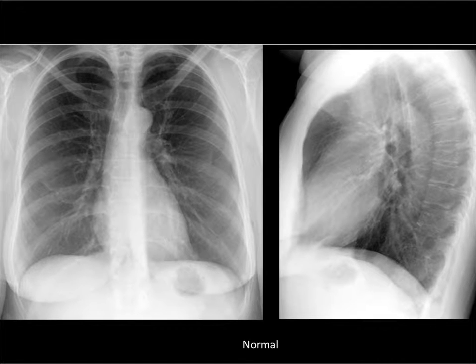Now let's look at the other side of the mediastinum. Now here we have our aortic arch, and then here is our main pulmonary artery with our left pulmonary artery coming out. Now in between our aortic knob and our main pulmonary artery is the AP window, or the PA window, depending on which side of the Atlantic you come from. The AP window should be concave, not convex. Sometimes in young women we can get it a little bit bumpy there, but generally speaking that is going to be concave.